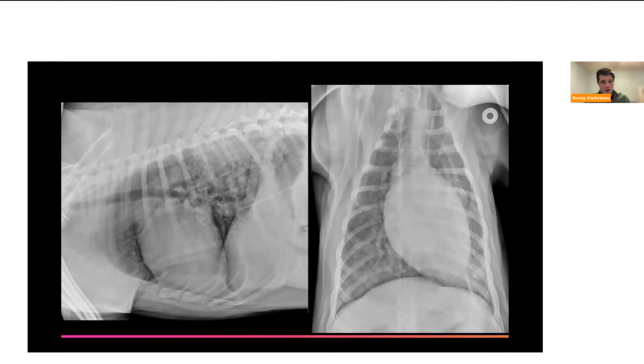In this case, the dog was severely azotemic. And so this is a case of bad uremic pneumonitis. And you wouldn't be able to call that out based on the radiographs alone. Like I said, all those other differentials are very plausible as well. But when you compare it with the clinical history, your exam findings, your lab work findings, now we can kind of piece it together.